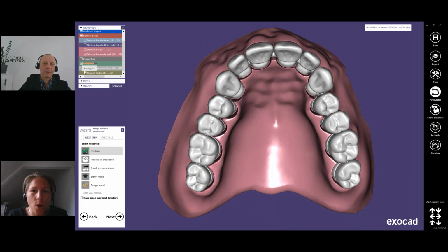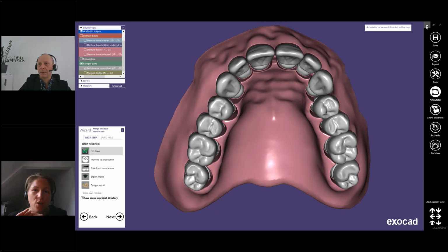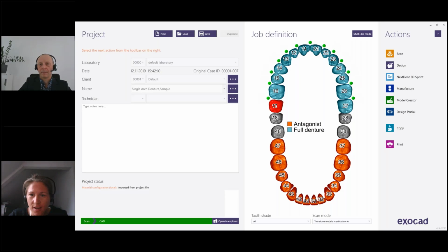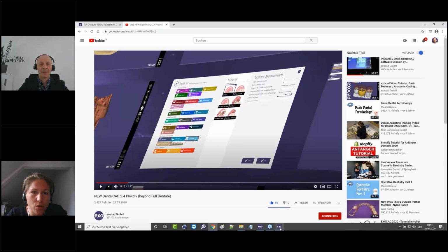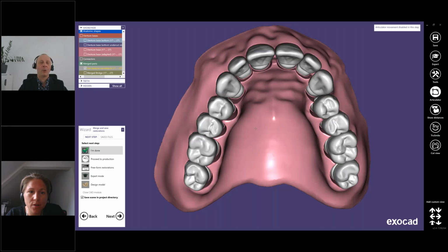But there is another option in the DB also with the monoblock, that you can also close it in totally. Maybe you will show it. Yes, you have not selected this one. If you optimize this for 3D printing, this will be watertight, and more printable. I just didn't do it to save time, because the calculation of watertight objects takes more time.